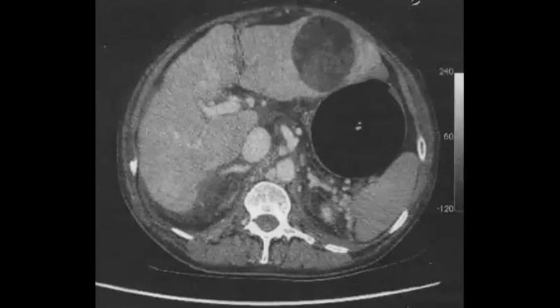Yeah, Nermeen, welcome. So after this patient, you saw it before, the liver cirrhosis, and now you see the lesion, how it changed. So what happened here, how do you describe it? You describe it as a fat-containing lesion. Yes. And also in the hypervascularity, it doesn't show much hypervascularity like before.